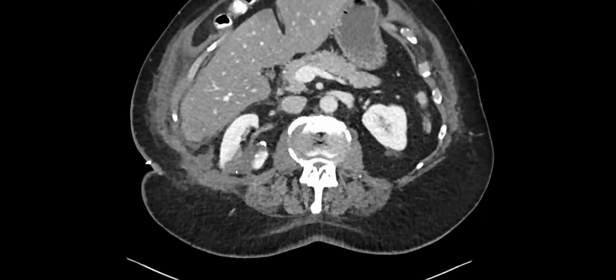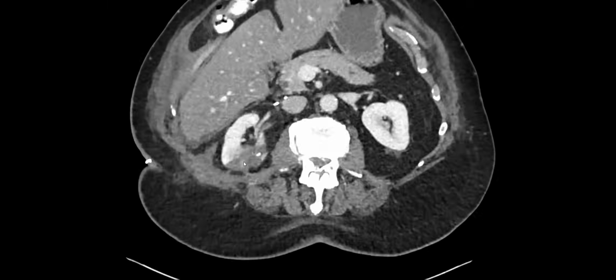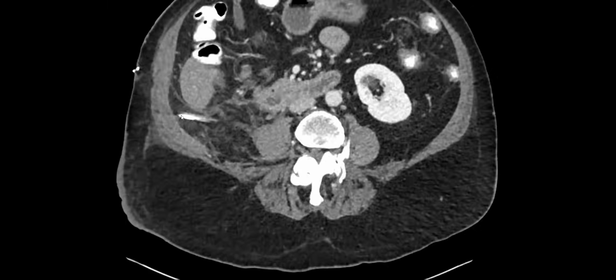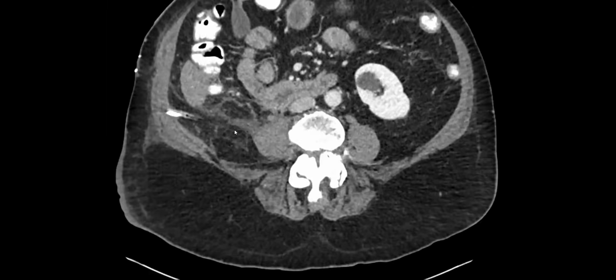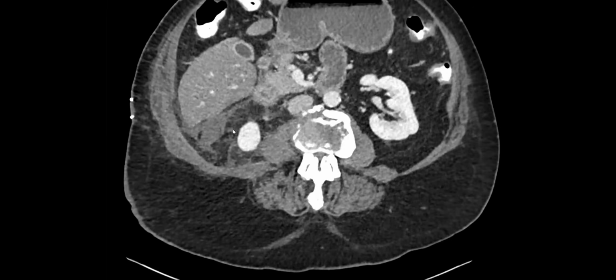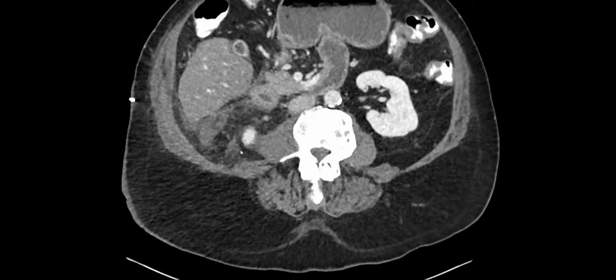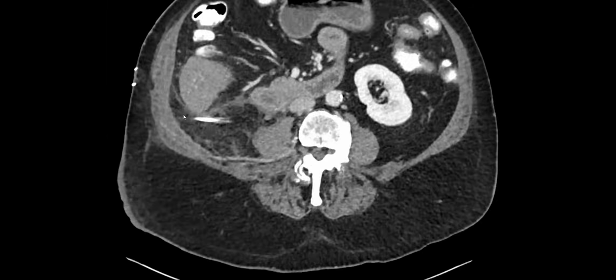Here they've done the partial nephrectomy, and there's some fluid around it. It's kind of within normal limits. And there's a drain here. So one of the teaching points is, anytime you're assessing fluid in a postoperative bed, you also have to know clinically how much is coming out of the drain.